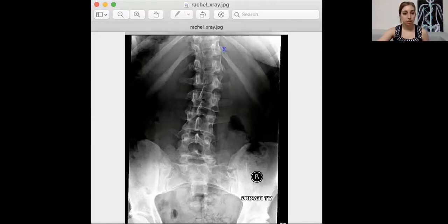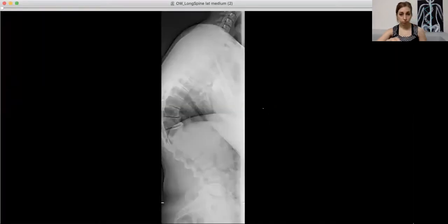The last little tidbit I want to share with you is for rounding, what's called kyphosis, specifically Scheuermann's kyphosis. Let's go over to this one. Okay. This is a picture of Scheuermann's kyphosis. You can have kyphosis that's just related to aging when you start to round, or you can have kyphosis that is being set into action by earlier bony changes. Scheuermann's kyphosis you typically see from childhood and adolescence, the same as scoliosis.